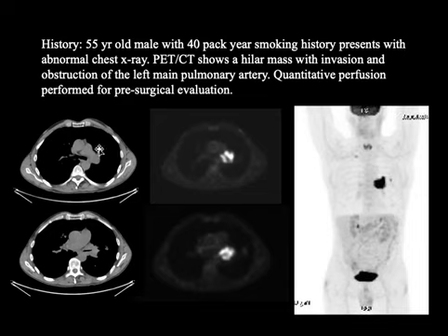Here is a CT image and the correlative PET CT image. Let's look at the whole body image first, where here is the focal hypermetabolism in the left lung, primary lung cancer, and there is a large focus in the left hilum consistent with hypermetabolic mediastinal lymphadenopathy. Now these two images are from the CT without contrast and the FDG PET at another level where we are seeing the left main stem bronchus and at the same level showing hypermetabolism in hilar lymphadenopathy.